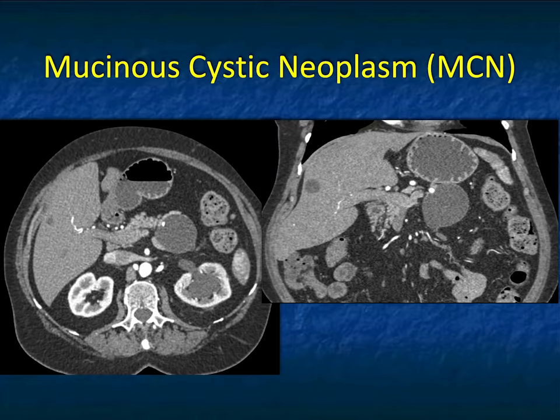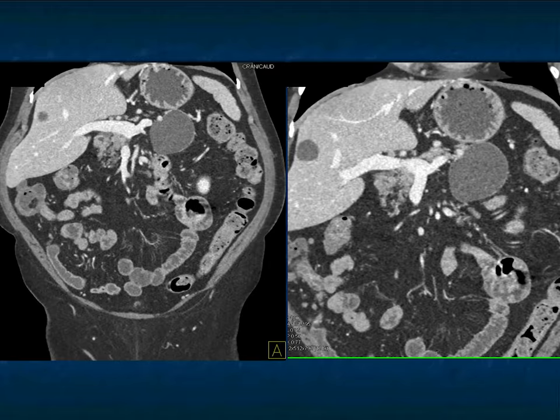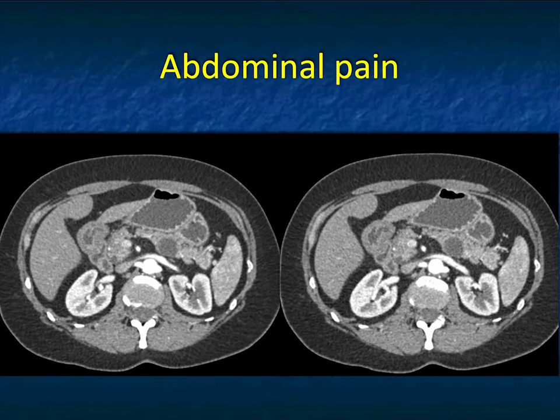Another one a little bit larger, same location. You can see atrophy of the distal gland. There's a faint calcification medially, which is not uncommon, but it's not dystrophic calcification. You can see it again through a range of views, and that was also low grade.